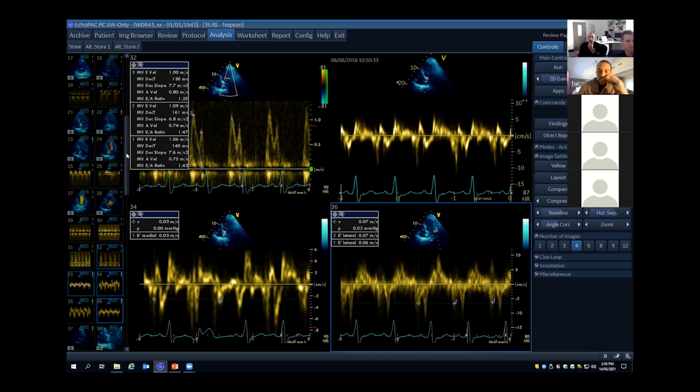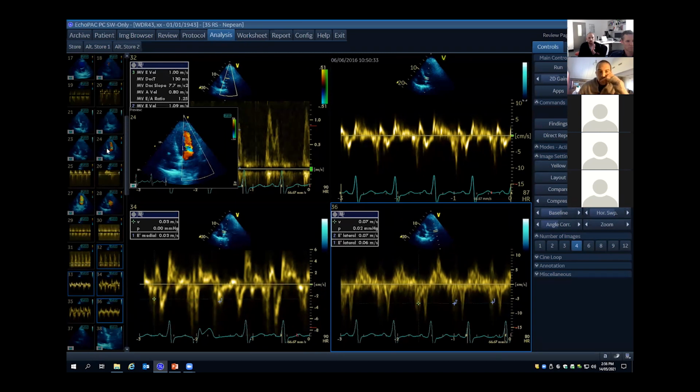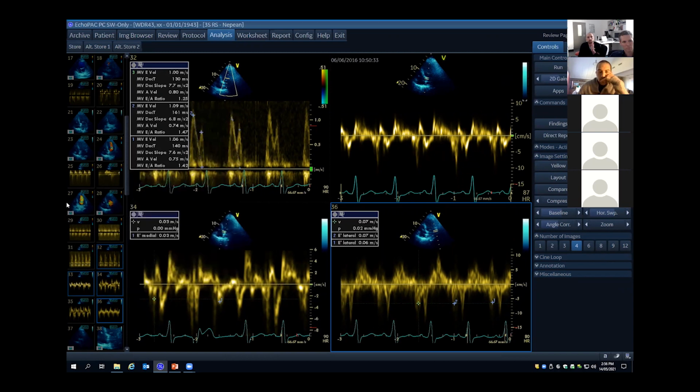All right. So looking at those mitral inflows and the mitral tissue Doppler velocities, there's probably some diastolic dysfunction with pseudo-normalization. I would say that an E to E prime greater than 15 is associated with high left atrial pressure, and also a wedge of 20 or so, and that would probably explain a cardiac contribution to failed extubation. Very nice.